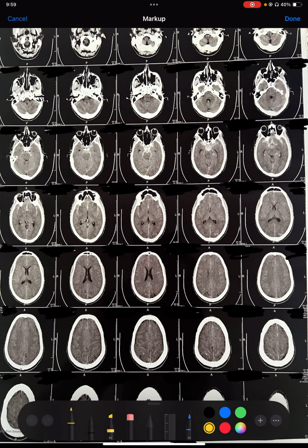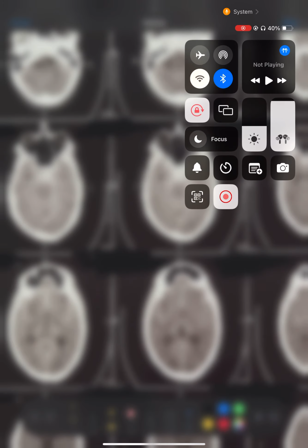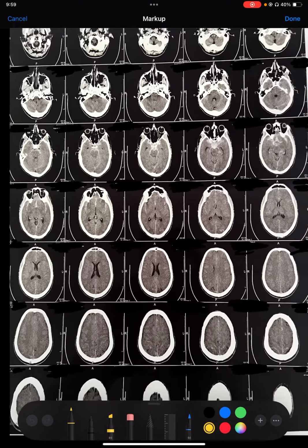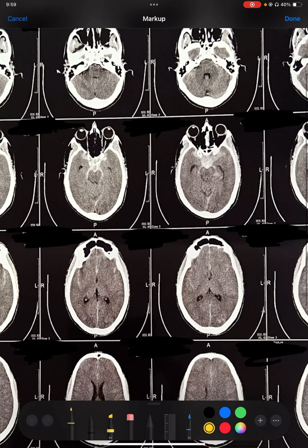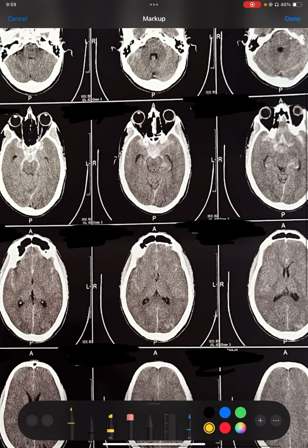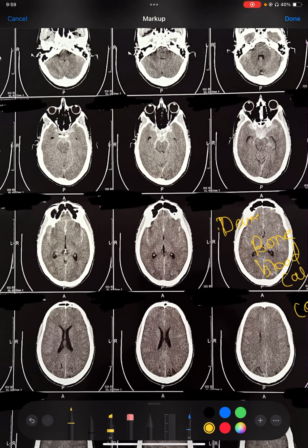Now you can simply pause this video and try to find out where the problem is. If you look closely, this is a CT scan of the brain, and what is evident on zooming is there is subarachnoid hemorrhage. I have told earlier also, a dense white structure on CT scan of the brain is bone, blood, calcium, or contrast. These are the four things which can be seen very dense white on the CT scan of the brain.